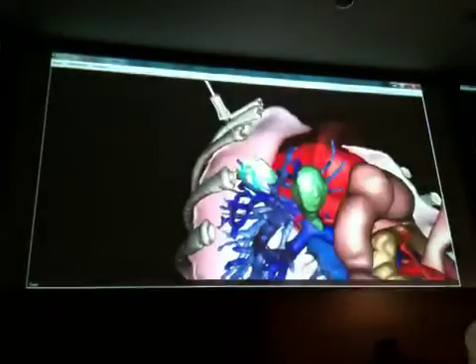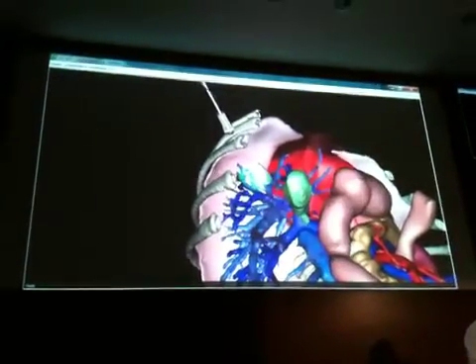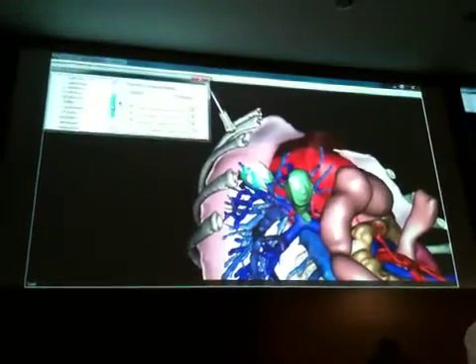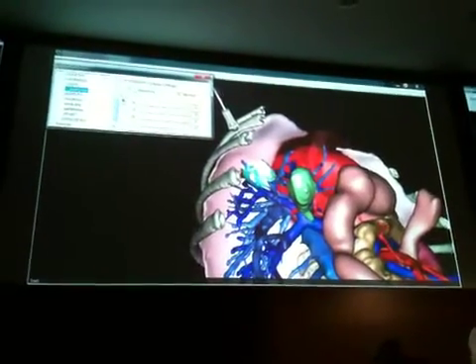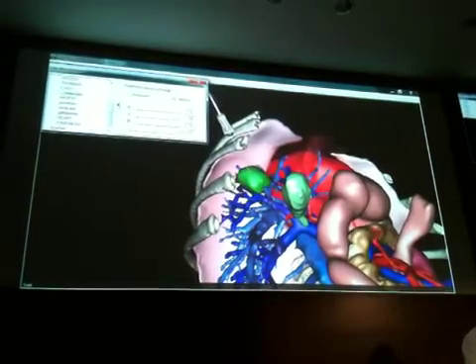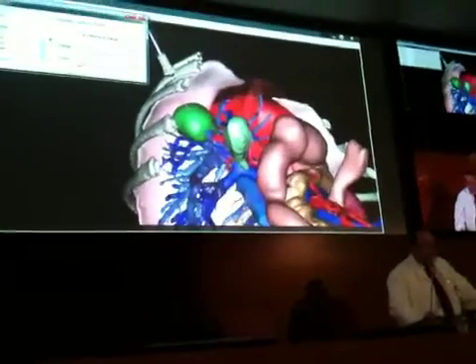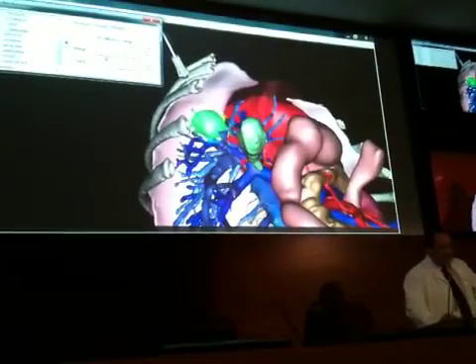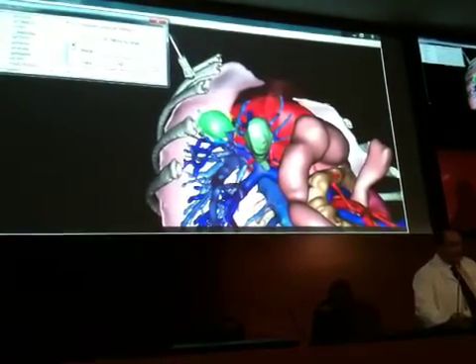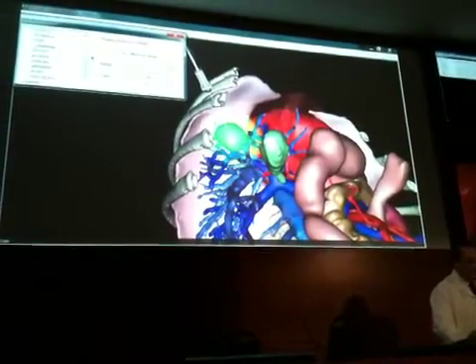You see, it's really interesting to have such a vision in order to avoid a bad positioning or to perform a good positioning. Now I can also do some other really important things. I can have the security margin of the burning effect here. You see, a 5 mm security margin, 1 cm here. I can show the size I want.